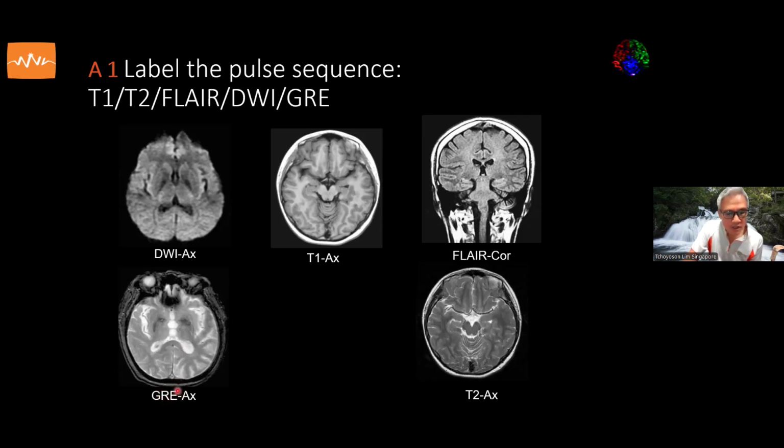So this susceptibility weighted image using a gradient recall image with a small flip angle is very sensitive to iron in blood or calcium. T1 and T2 weighted images are relatively insensitive to blood products, but a gradient, GRE or SWI, will help us to overcome that problem and detect small amounts of blood in hemosiderin or subarachnoid hemorrhage.